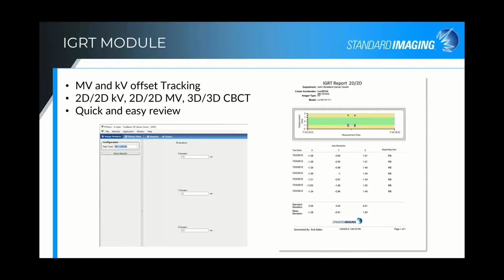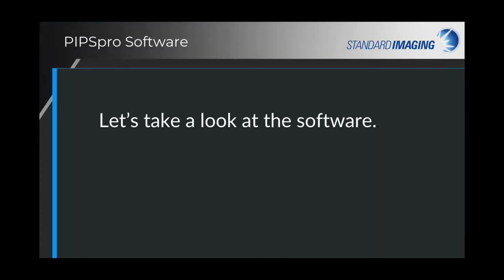So that was kind of a quick run through of the modules that we have. So I'm just going to jump in the software. Like I said, I'm not going to do a full run through, but I'm just going to show you some of the navigation, a couple of the different tools that are available within the PIPS Pro.